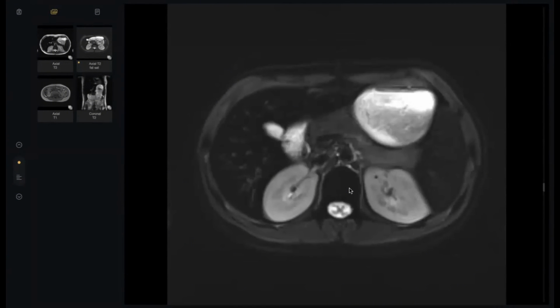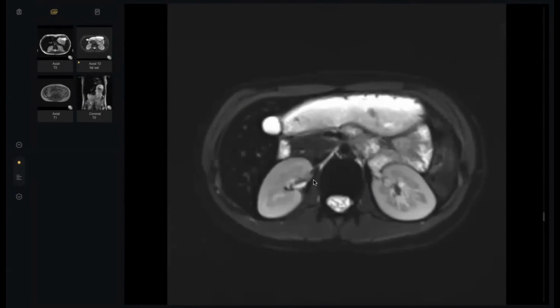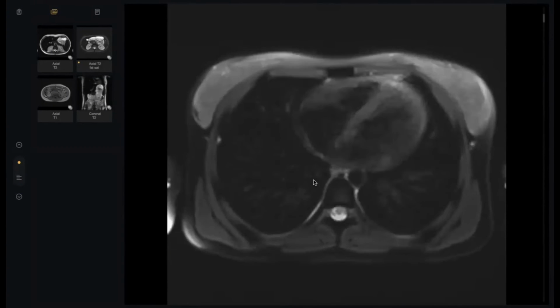Type 1 is due to some abnormalities in the carrier of the iron or absorption of the iron. But type 2 is due to multiple blood transfusions. By the way, this is a case of thalassemia, which has multiple blood transfusions and multiple iron infusions.